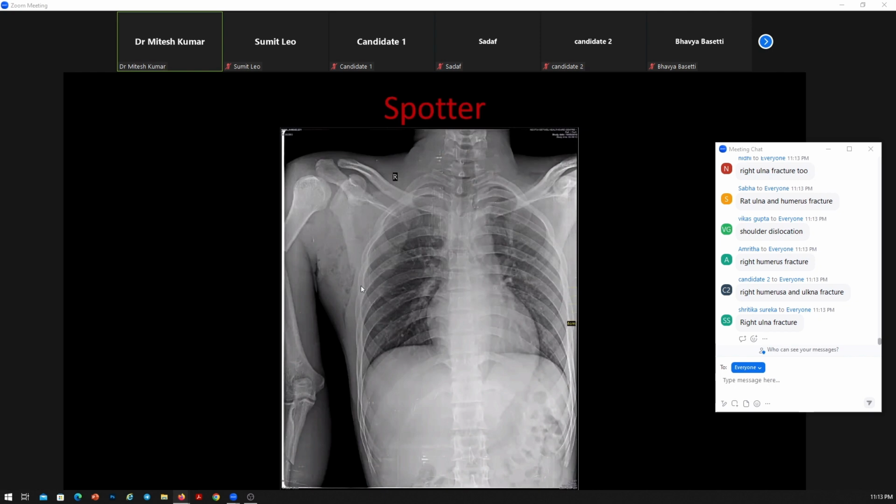So, Dr. Mitesh, sorry to interrupt you. What about the subcutaneous emphysema? So yeah, even that is there. Yeah, that is also there. Thank you so much.